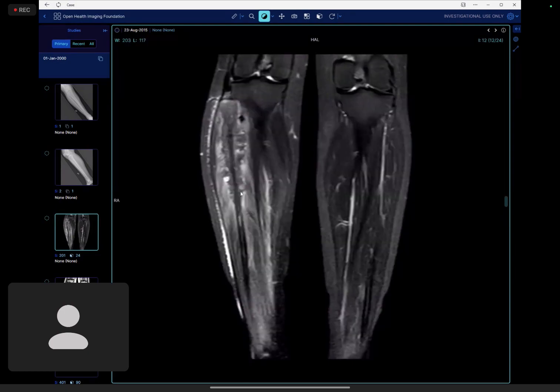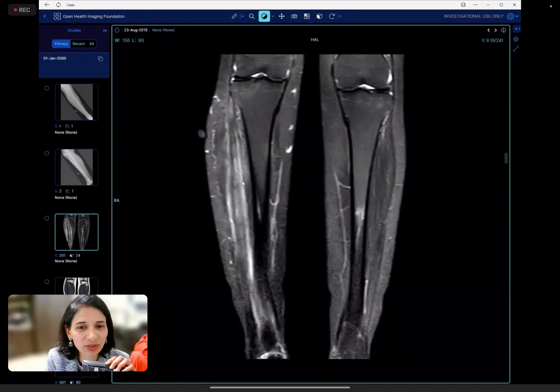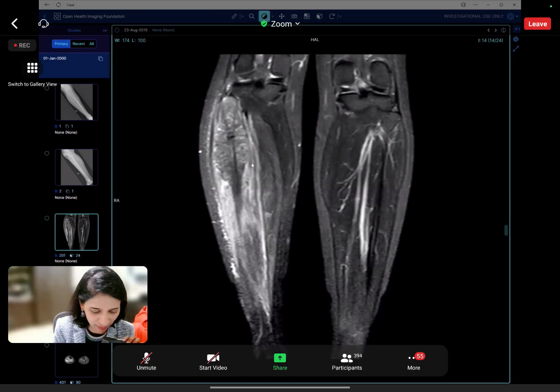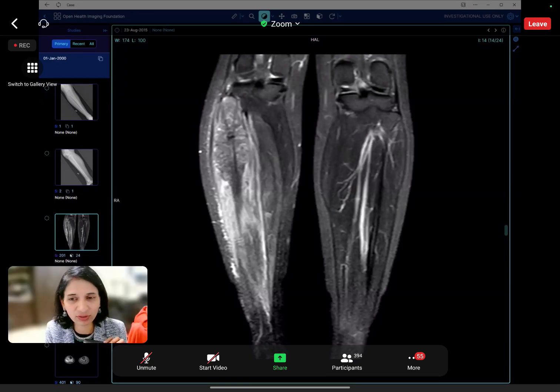So agree that if it's a very young patient, then you wanted to give Ewing's, and that's a good differential to offer. But this was a 45-year-old, very unusual. This turned out to be a colonic metastatic deposit. So don't forget in an older patient to give mets as one of the things.